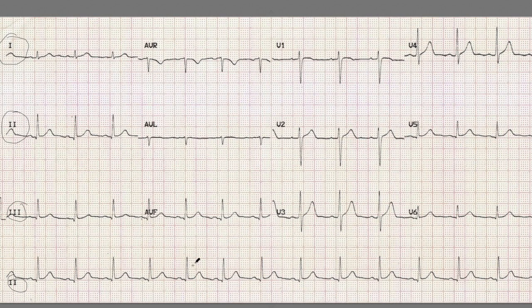When we talk about the ECG, we normally start off by talking about the rate, how many times a heart beats in a minute. As you can see over here, this one ECG waveform represents one heartbeat. So essentially, in this strip, you have 13 different waveforms, and that means in the time that we started over here, all the way to the end, we've had 13 beats.